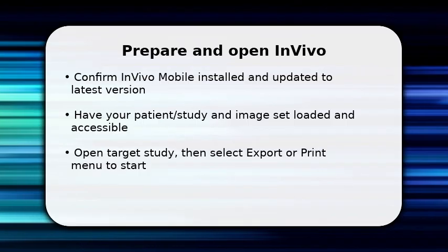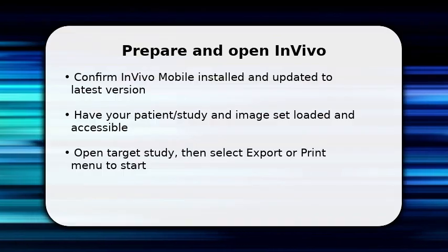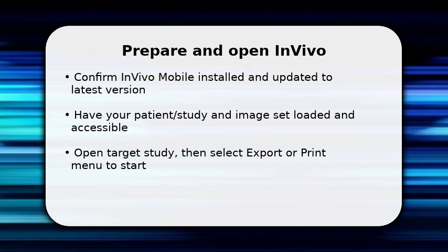You choose which series or screenshots to include right away because selecting at the start saves rework. Also verify annotation layers and patient header data are visible. This determines what appears in the final PDF.